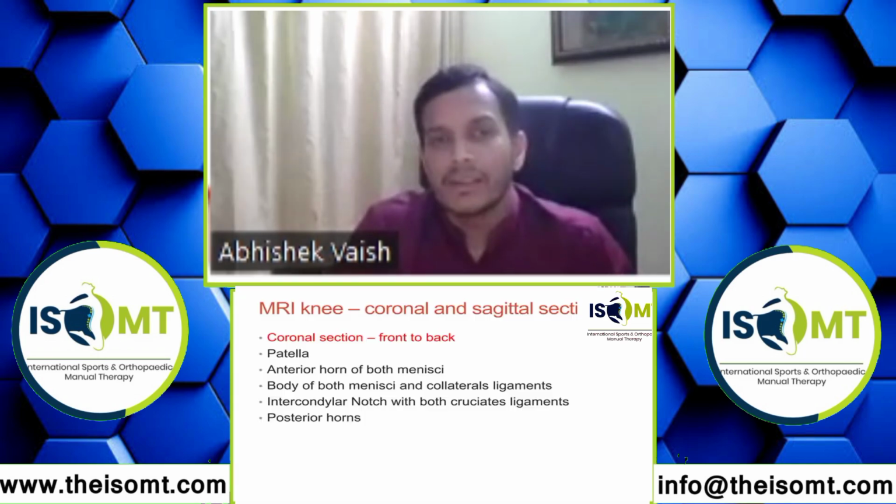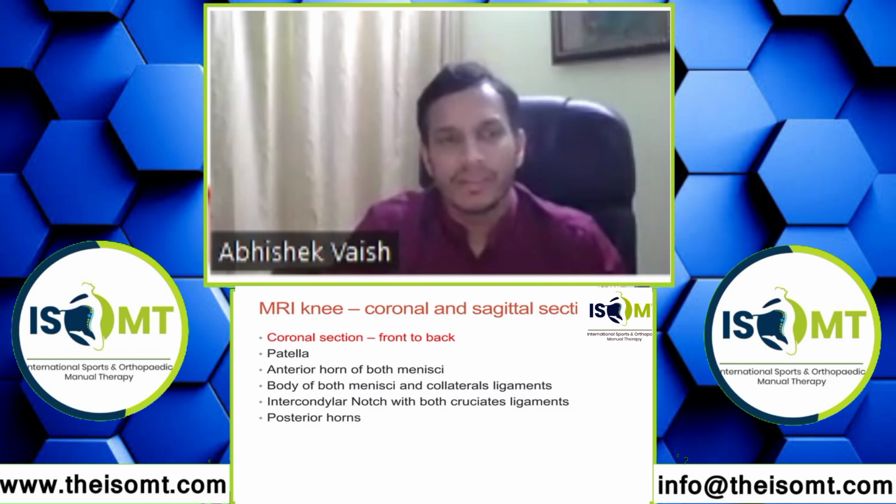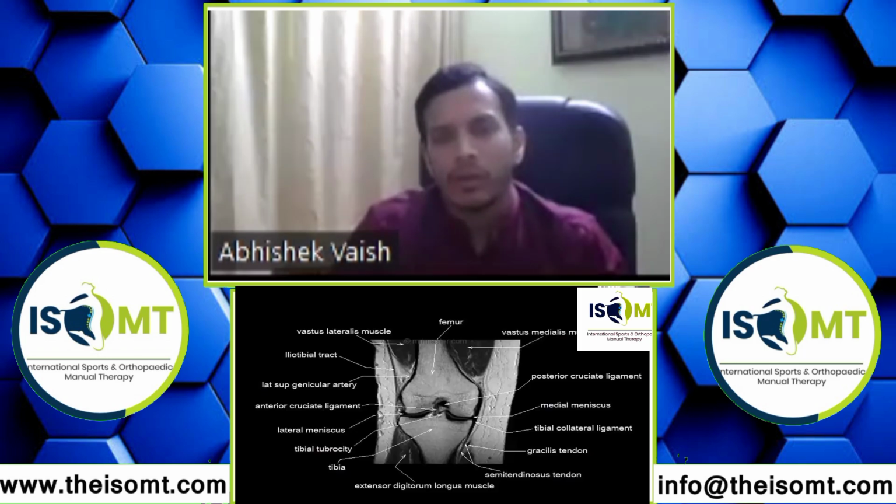Mainly there are 3 cuts in an MRI which you should know. One is a coronal cut, one is a sagittal cut, and one is an axial cut. In a coronal cut, when you go from front to back, first you encounter the patella, then the anterior horn of both the menisci, the body of both menisci and collateral ligaments, the intercondylar notch with both the cruciate ligaments, and the posterior horns of the menisci.